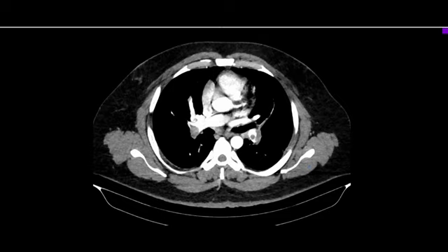So you calculate the score in your patient, and you can even give the percentage involvement by dividing the CT clot load score in your patient by 40, that is the maximum total score, and multiplying by 100. That will give you the percentage involvement.